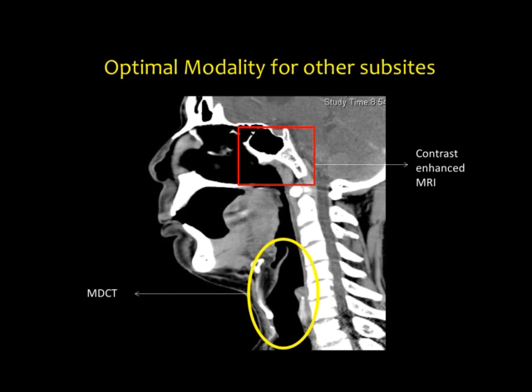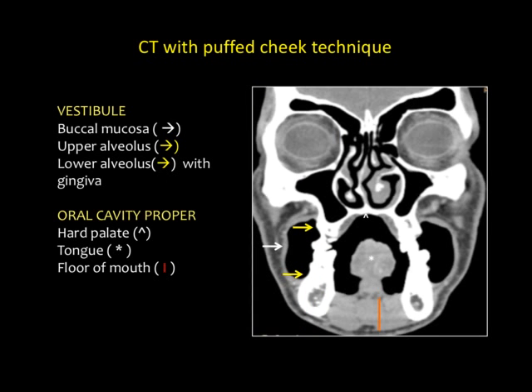The protocols are not standardized, but once they are standardized, with the ultra high fast MRs, the larynx imaging would be replaced by MR. And we see quite a lot of cases these days where there is subtle paraglottic invasion, or a young adult where the cartilages are still not ossified, and there you find it difficult to differentiate cartilage erosion, because the cartilage is not ossified, there is no concept of erosion or invasion. The white line of cartilage is just seen. So there MR would be an adjunct.